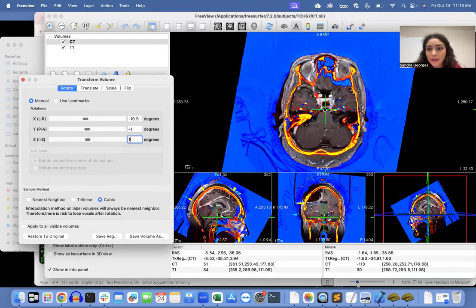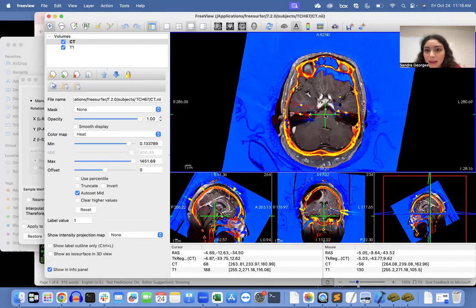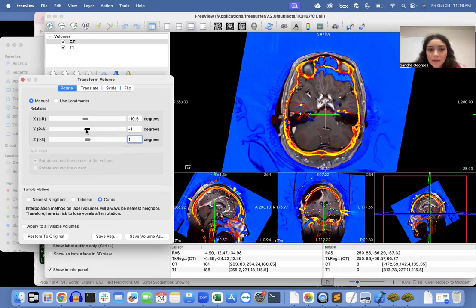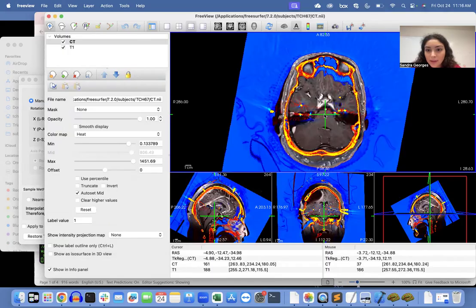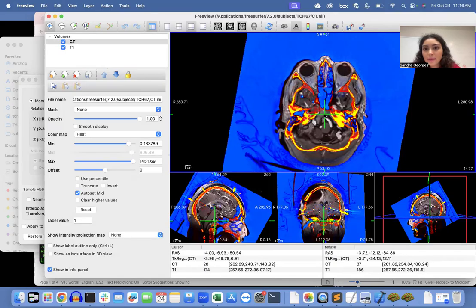There we go. This is looking a little bit better. I also like to use the space here next to the eyes. Kind of helps get a sense of where these little edges should be. I think still a little bit uneven, which is fine. Let's do maybe one more. Maybe like 0.5. Sometimes I also manually input the numbers. That's a little bit better. Okay, so far it's looking quite good.